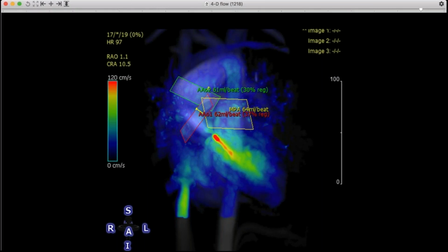There is a degree of stenosis. You see the dephasing artifact right here. You see a little bit of it there, but it's more regurgitant now at this point. It's almost more of a membrane, I think, than a true leaflet. But you don't see real hypertrophy in the left ventricle with a long-standing high-grade stenosis. So it's really the regurgitant portion that's the problem in this case.